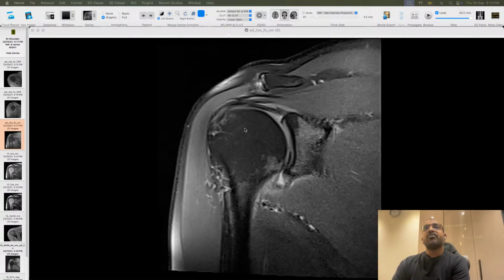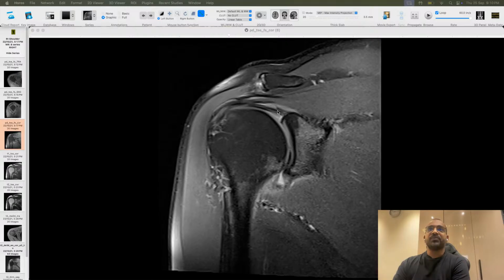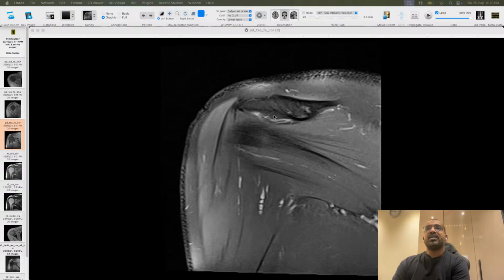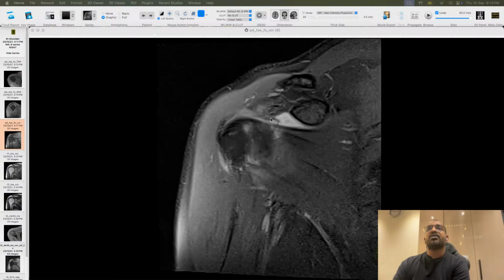Very good. So the long head of biceps tendon, if you see, is coming from the superior glenoid tubercle. This long head of biceps tendon is intra-articular in portion. It runs in an intra-articular plane. So that is one thing. So where is the short head coming from? We have to see the short head also, right? And most of the times we write only long head of biceps.